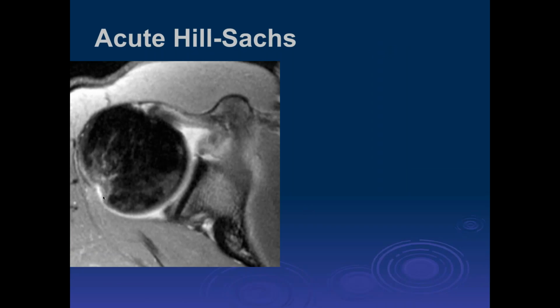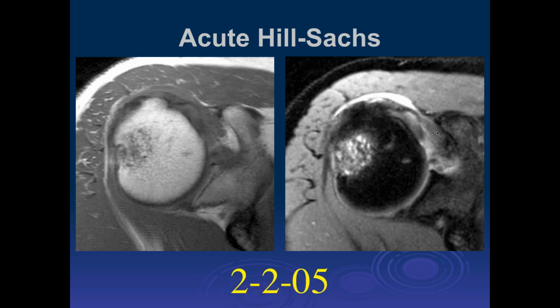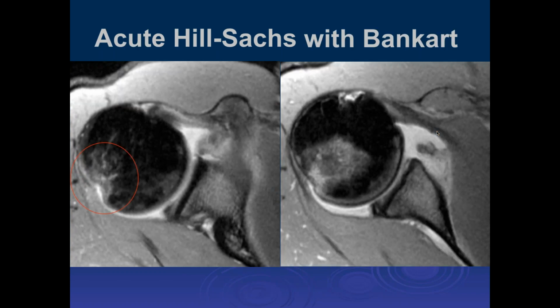And here we can see another acute Hill-Sachs lesion with bone edema, typical V-shaped appearance of it in that location. And here we can see the labral tear where the labrum is displaced, the abnormal configuration, and we also probably have stripping and tearing of its periosteal attachment in that location there. And this is now, let's see, this one. Yeah, that looks chronic, then, John. Yeah, the Hill-Sachs is acute. It's probably glenoid dislocations. That's right.